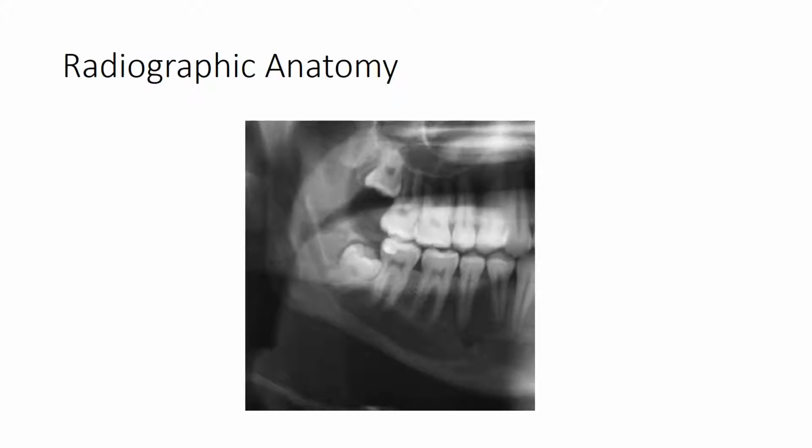Shown here is a cropped image of a panoramic radiograph demonstrating normal dental and periodontal structures. Note the radio-opaque amalgam filling material in the crown of the right mandibular second molar. There is no evidence of decay on this image. There's no coronal radiolucency, and the enamel dentin junctions are intact. Also, the alveolar bone is at the appropriate level 1 to 2 millimeters below the crown root junction.